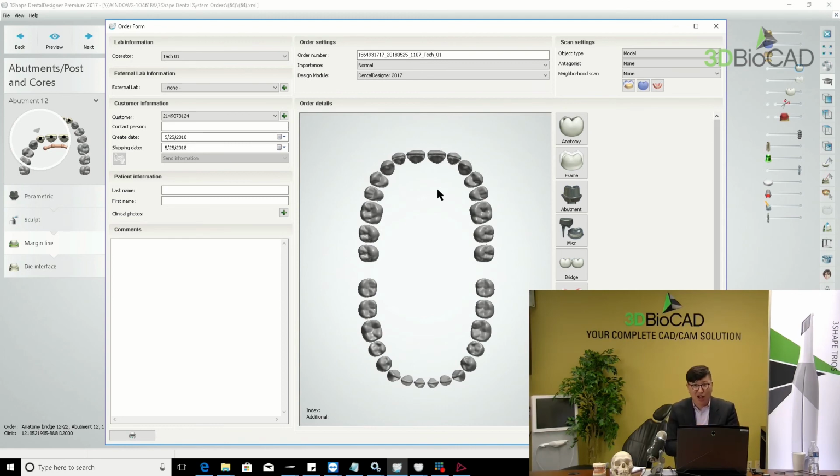This is something prepared and having some more information there. So that is not a raw file anymore. We want to use that information. So if you set it as a digital impression, it will tell you to do the scan body aligning. Not make sense, right? Because we already have the implant position. Okay.